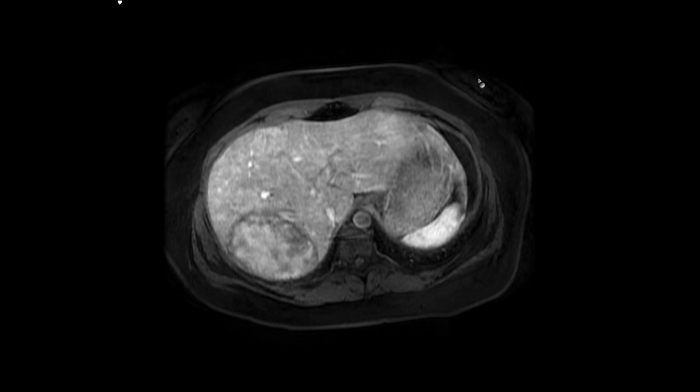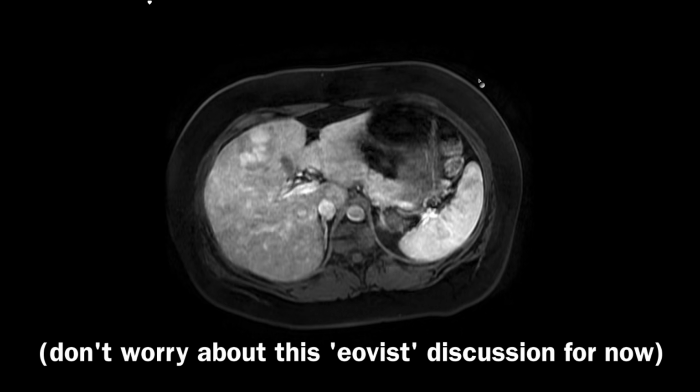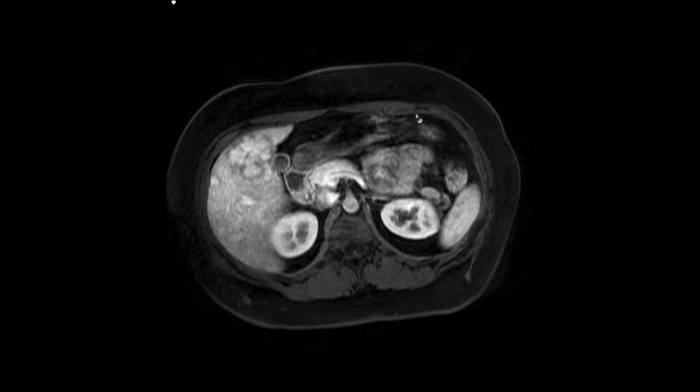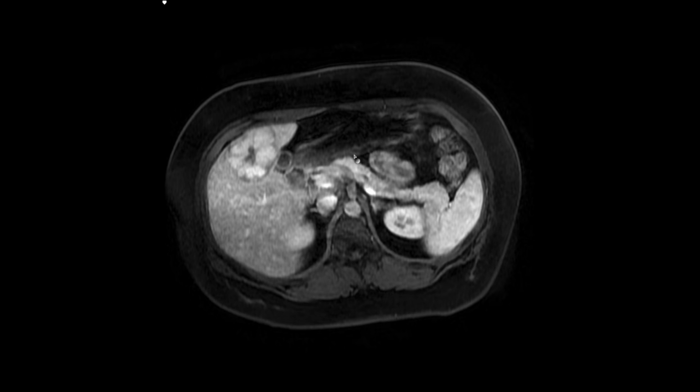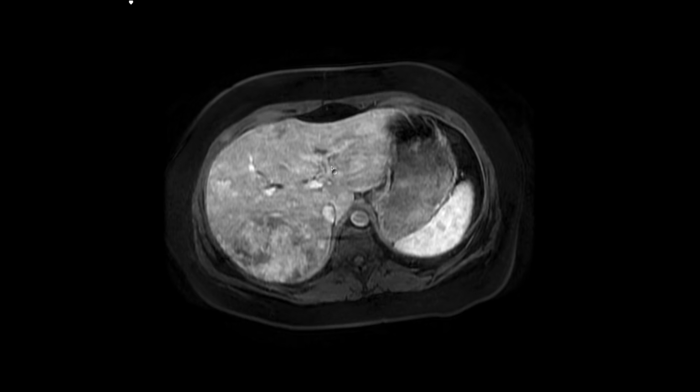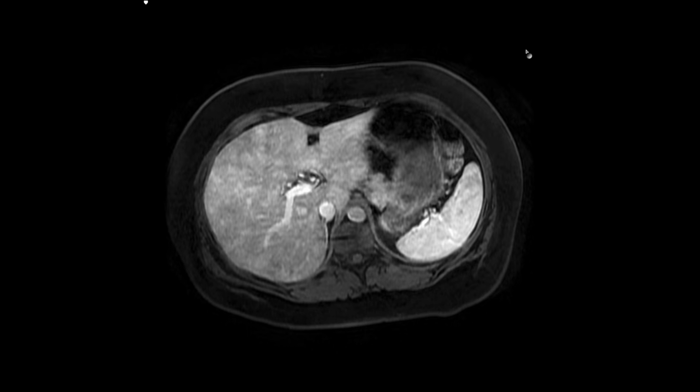Actually, I should mention that this is an EOVIST study, so we didn't give normal gadolinium contrast or purely extracellular gadolinium contrast that we're used to using in MRI. EOVIST or Primovist is a 50% extracellular contrast agent and 50% hepatobiliary agent that is excreted in the hepatobiliary system.